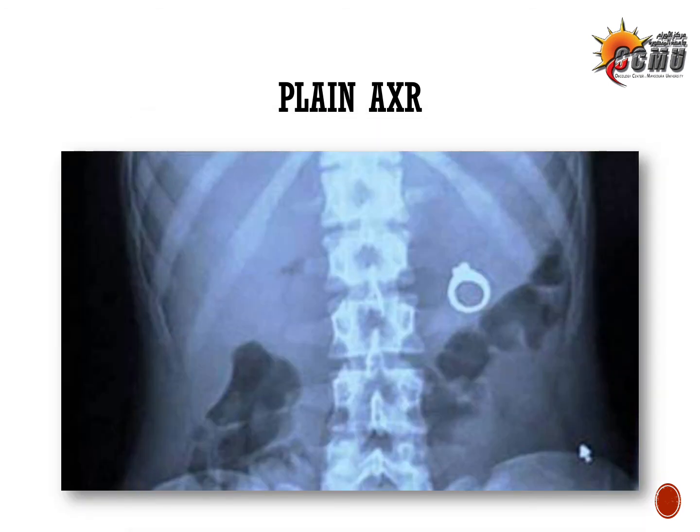This is another film. It has an interesting story. A man from New Mexico plans to propose to his girlfriend, and he slipped a ring in her milkshake, thinking that she can feel it in her mouth, and she sips the milkshake, but actually she swallowed it, and it was in her stomach. It was extracted safely with upper GI endoscopy.